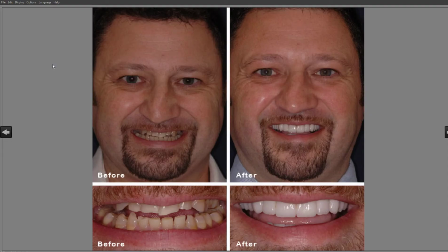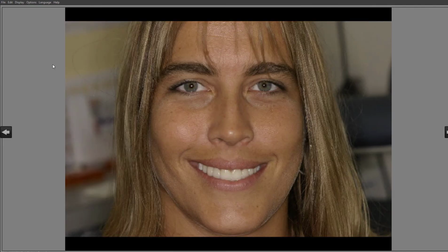You can use this educational library to show the quality of the work, to show other people that have accepted these treatments, and to explain those wonderful stories that shows how a wonderful smile can transform somebody, physically, emotionally, confidence-wise.